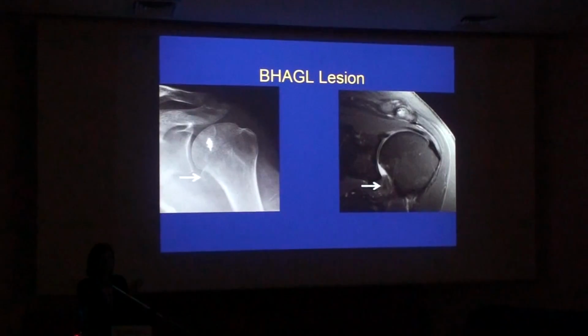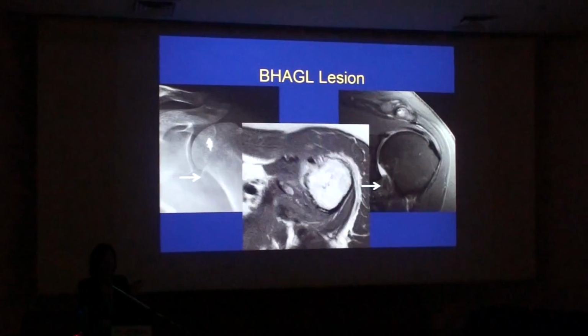And so we did an MR, and we saw that it's kind of black here, it's hard to see, but it was a piece of bone avulsed off of the humeral neck at the insertion of the inferior glenohumeral ligament, so that's a bony avulsion, a BHAGL lesion. I don't know if they're going to go in and fix it, it's old, but it's an explanation for what you're seeing there.